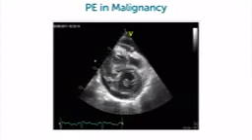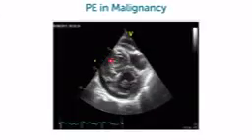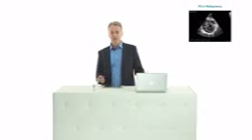And what about this patient? Well, a sad story. Again, a rather young male patient with malignancy. He had melanomas and he had secondary tumors also in the heart itself. You can see them here in the right ventricle. Look at this irregular contour of the left ventricle here, probably also tumor in the left ventricle. And as a consequence, he has a so-called malignant pericardial effusion. Such pericardial effusions can get quite large and can cause hemodynamic compromise. Now, of course, you will have to look at the clinical situation the patient is in, but if he does develop symptoms, you will have to tap this patient.